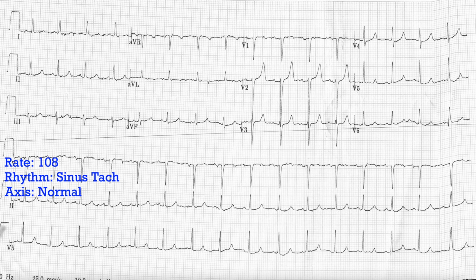So if you look at the distance from this R wave to this R wave, does the T wave get finished before you get halfway there? And it looks like it does. It's maybe right on the borderline, but I don't think this is certainly any clinically significantly prolonged QT interval. So we'll call these normal PR, normal QRS, normal QT. Nothing else looks really out of place. Let's call this normal intervals.